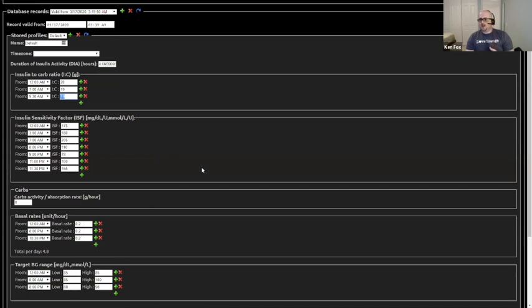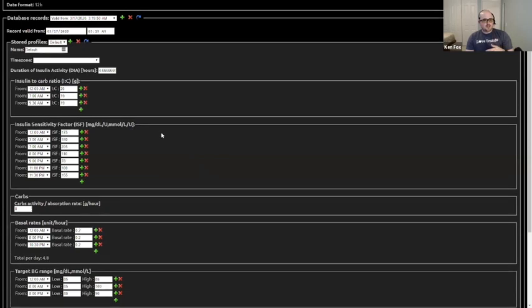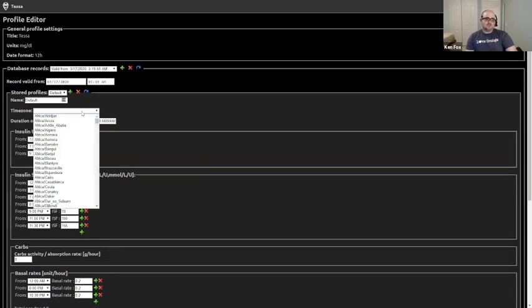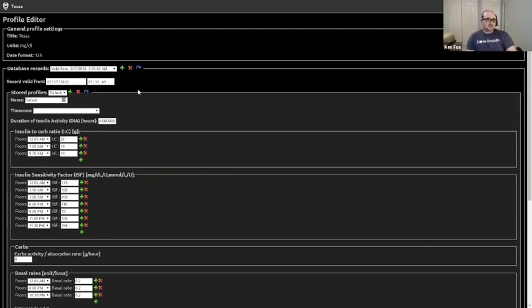Odds is asking why is the DIA 5.1666667. Again, that's one of the bugs I see currently in between Nightscout and Loop. I don't think Loop's uploading data to Nightscout perfectly well right now. So you're getting these weird rounding errors, like 4.6 was supposed to be 4.5, and I changed my DIA to 5. This is 5.1 and change. So some things to be worked out, bugs to be reported I haven't done yet. I don't think anybody else has done either. Time zone doesn't fill out, and I think that's actually causing a bunch of other problems that we'll talk about later.